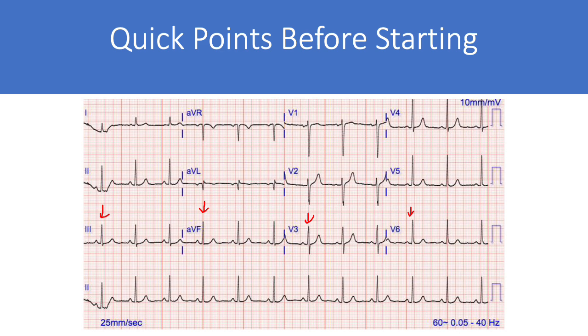And so, the beats that actually correspond to each other. If we take a look at the first beat in lead 2, this beat corresponds with this beat, and this beat in leads 1, 2, and 3. And if I were to move down the line and choose another beat in lead 2, that beat that I'm marking in blue again corresponds with the beat directly above it, corresponds with the beat directly above that, and so forth in leads V1, V2, and V3.